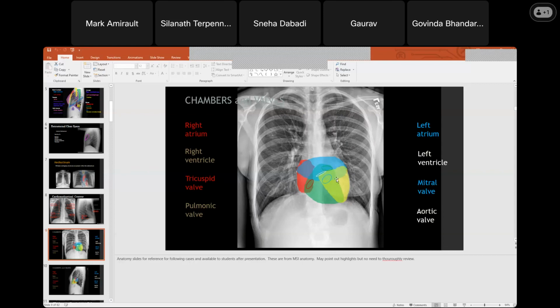And a trick sometimes people use is you kind of draw a line from this angle here up to the shoulder. And the aortic valve will typically be above that and the mitral valve below. And also just look at the medical record, of course, if that's available.